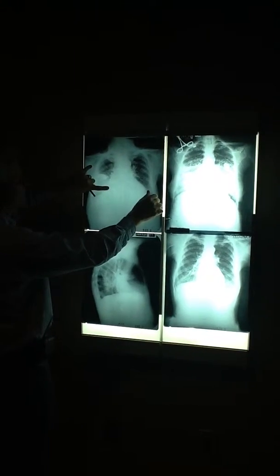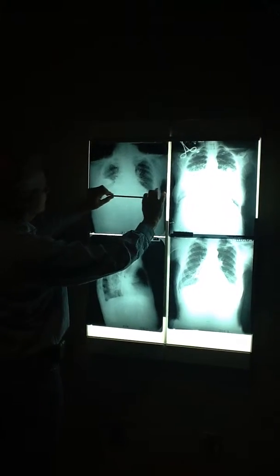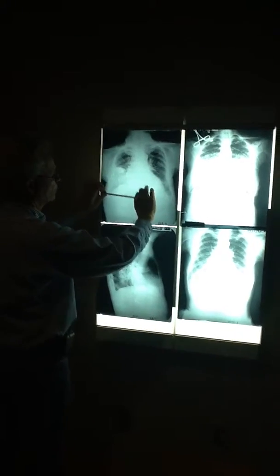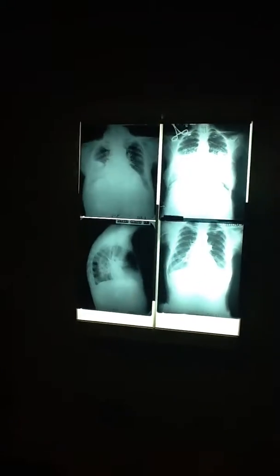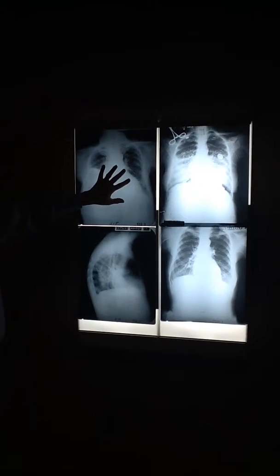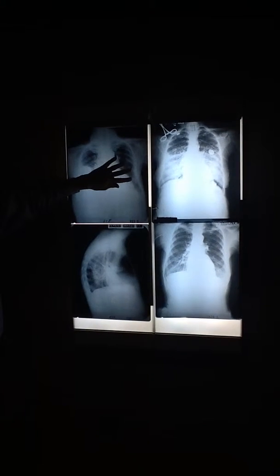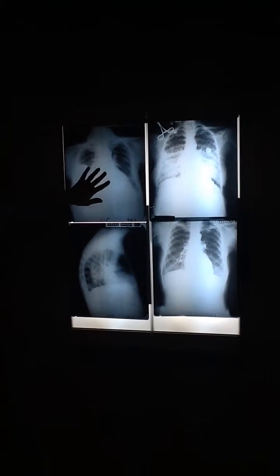See how big the heart is? That would be a positive cardiothoracic ratio. Oh yeah, there's no question. That's probably pushing 60%. And then a very prominent left ventricle here, because this patient has congestive heart failure. That's why they've got venous hypertension. They've got, you know, reticular changes.